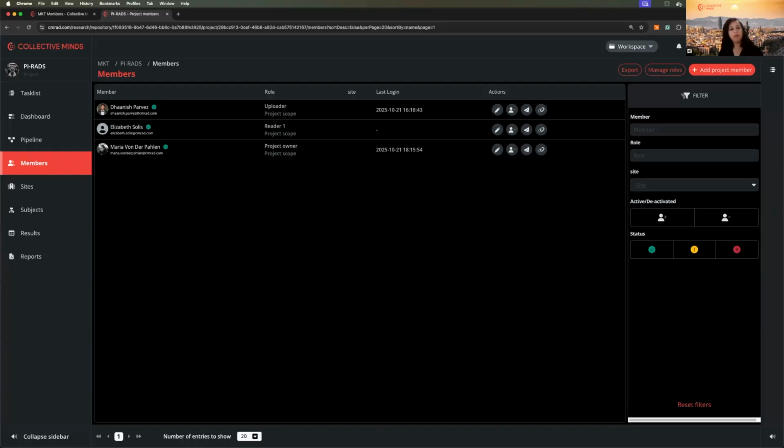So again, you had all this information, but you had to take several steps to get to it. So what we did here is we took the very specific information that's important related to members, and we put this on this model that you can see now. And it's much easier to just go over the member that you are interested in and see the information, and that's it. And also you can export this information, just information regarding members, from the member screen as well.